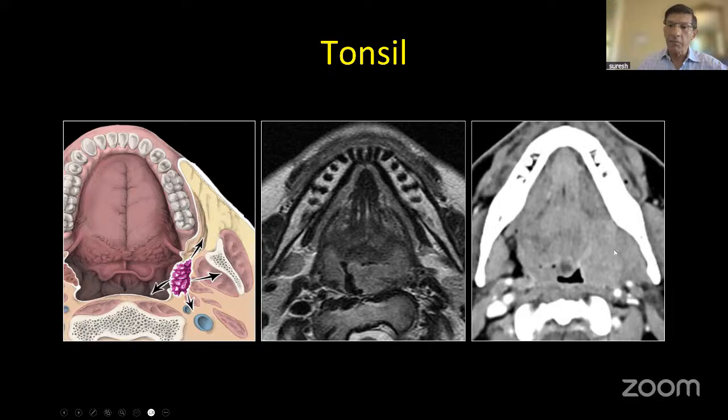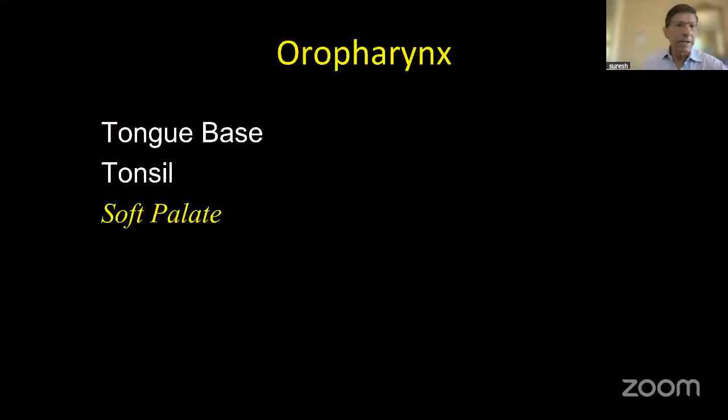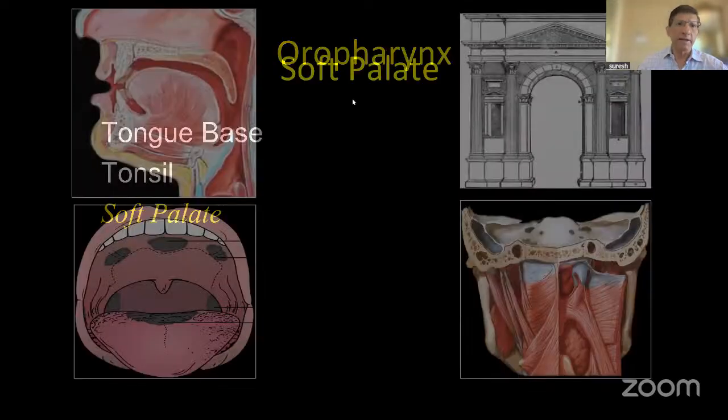So from our standpoint, anytime that I see this, and I also say this tumor is in close proximity to the carotid artery, I'm not necessarily telling how to treat these patients, but this type of information needs to be integrated into this thought process. And from a surgical and a radiation oncologist standpoint, they can take these key elements and then determine how to treat these patients. The next area that we'll talk about is the soft palate.